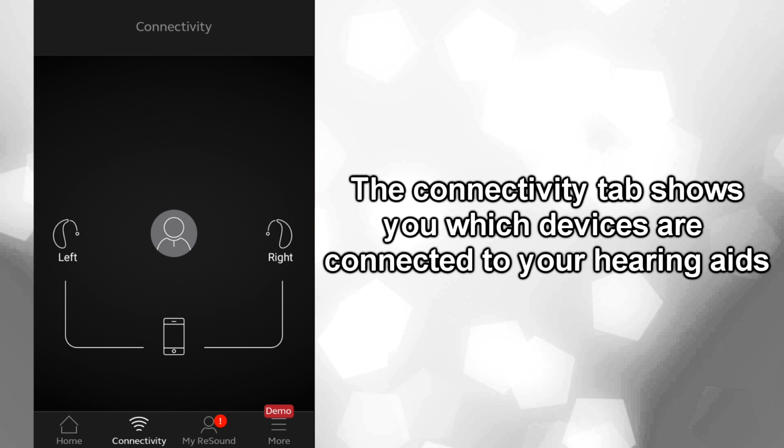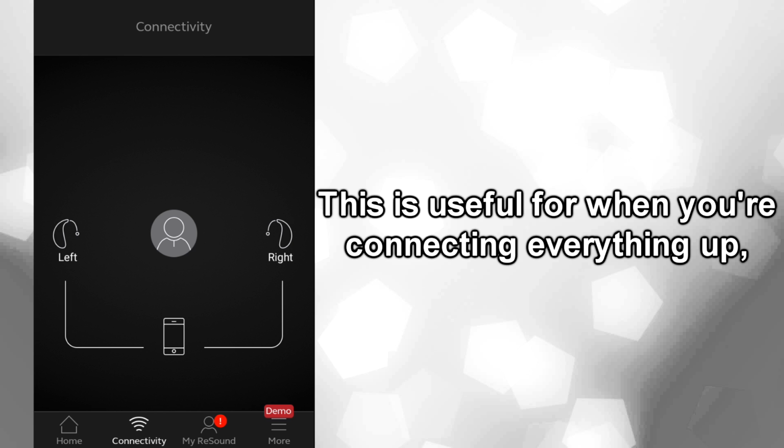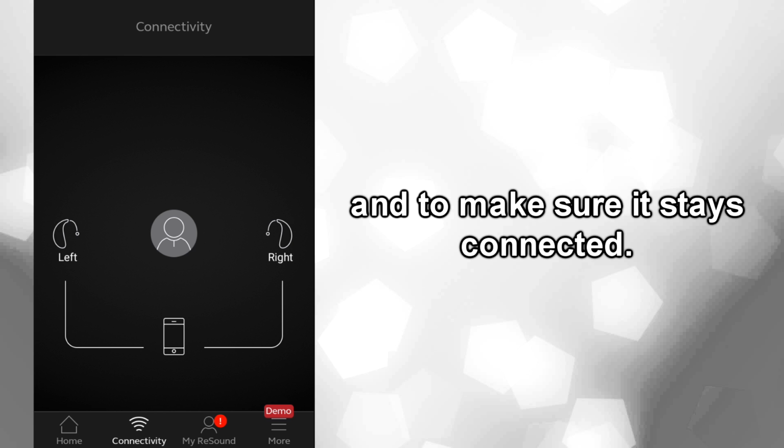The Connectivity tab shows you which devices are connected to your hearing aids, and further, whether or not your hearing aids are paired with your mobile phone. This is useful for when you're connecting everything up, and to make sure it stays connected.